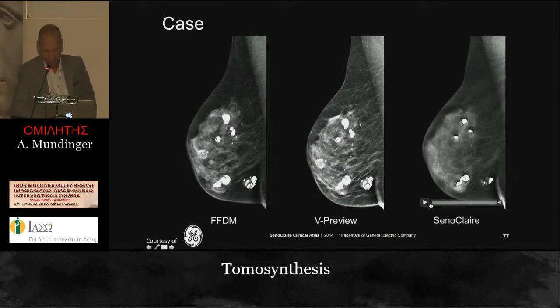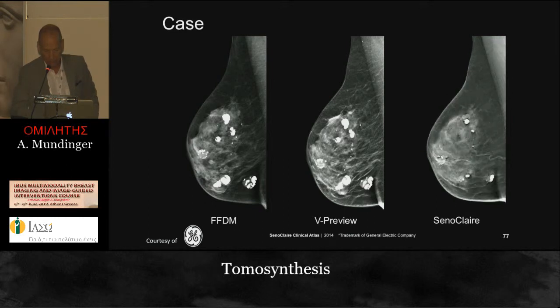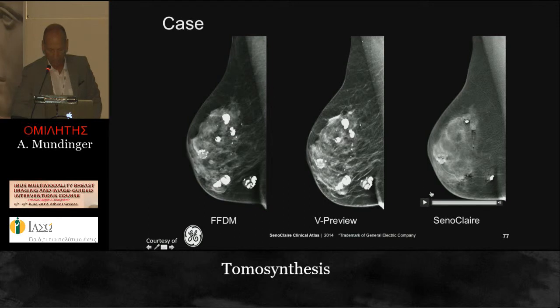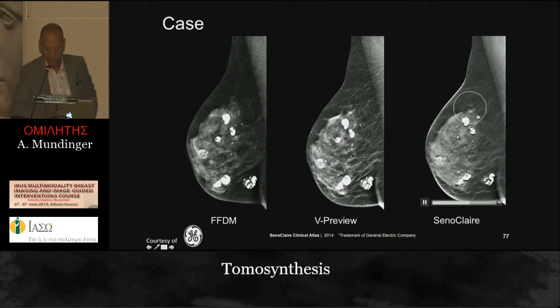These are several calcifications, and in some cases, here we have the DBT, and sometimes you can in addition find a cancer. This is really a difficult breast. You look at the calcification, you don't believe there's anything strange, but look again, DBT shows you there's a clear architectural distortion in this area, and this is a little cancer.